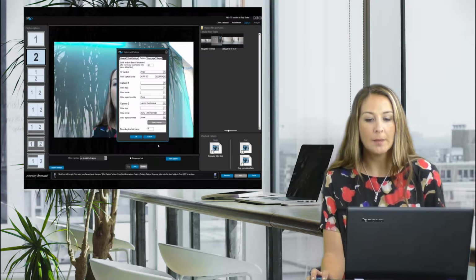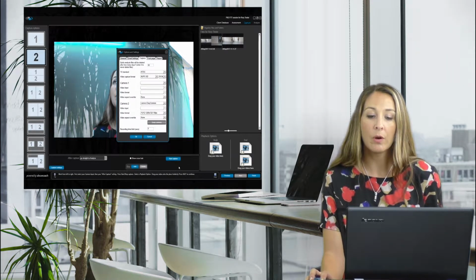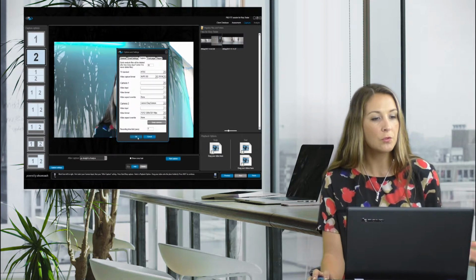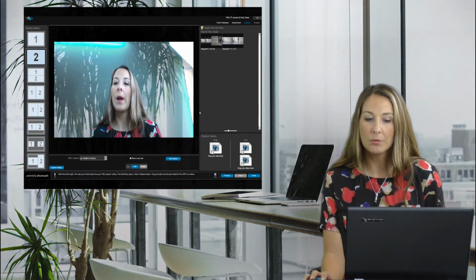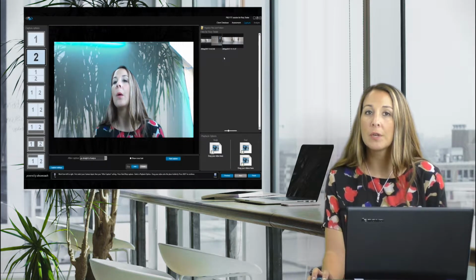So if we were conducting a report right now, or we were going to actually do an analysis, we would do start capture right here. So there's lots of different options for this. If you do purchase the software, this will all be gone over in more detail in training. So I will just click OK there. And what I'm going to do today is show you how we can do a pre and post fit report.